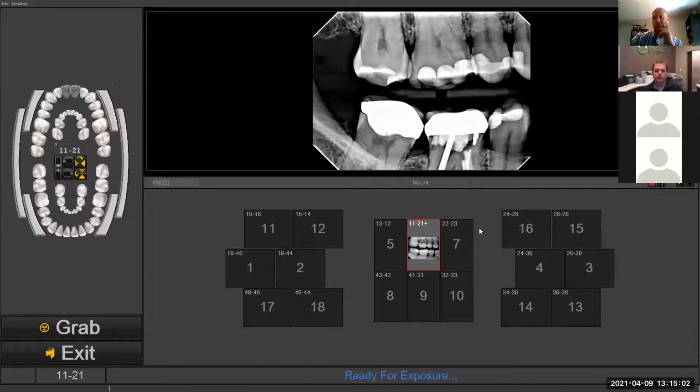Correct. We could probably program two separate buttons if it couldn't work simultaneously. Normally, when you have the same family, you might have a number one, number two size difference, and when you launch the software, it actually automatically will pick up the size before we even have to choose, like, okay, I'm using my number one now, I'm using my number two. Now the computer automatically sets it up and we can register the sensor in the system. So I believe, I don't want to say 100%, but I do believe that we could solve that issue either through the way we register the sensor now, or by having an additional button if, in the worst case, we had to designate a separate system to work separately.